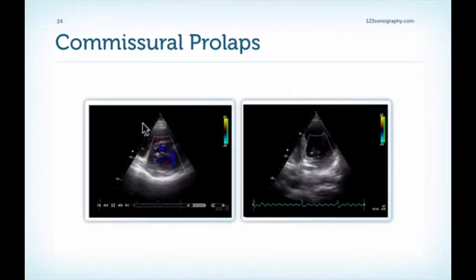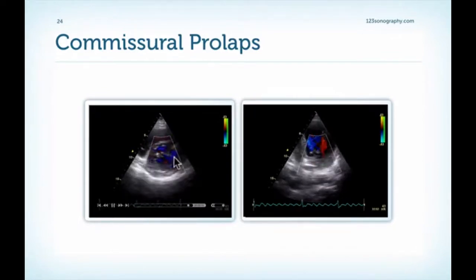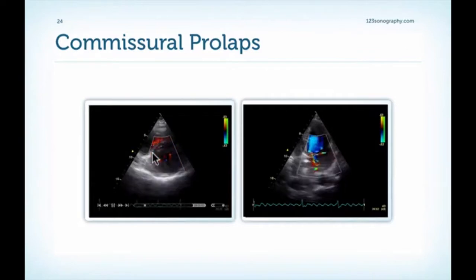First of all, use the parasternal short axis views right at the level of the mitral valve, where you can see the anterior leaflet and the posterior leaflet. And these regions, remember, we learned that in the chapter on how to image. These regions here are the commissures. The anterolateral commissure here and the posterior medial commissure here. And here's a very nice example of a jet that originates right here from the commissure, the posterior commissure.